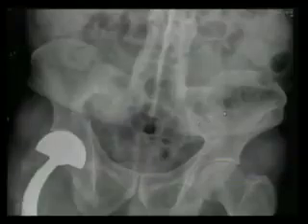That's okay. It's iliac lower. The iliac side is worse, and the lower half, because that's an actual synovial joint. So the lower half and the iliac side are usually worse in sacroiliitis.